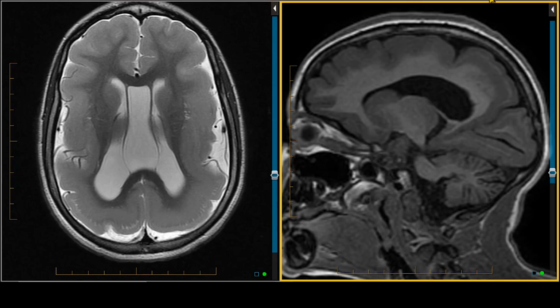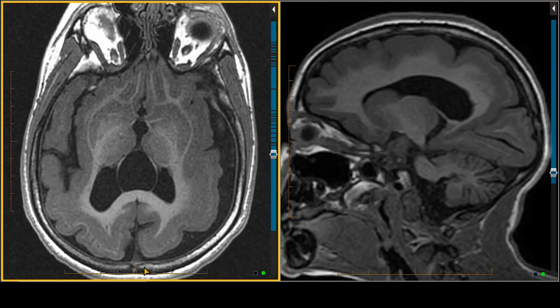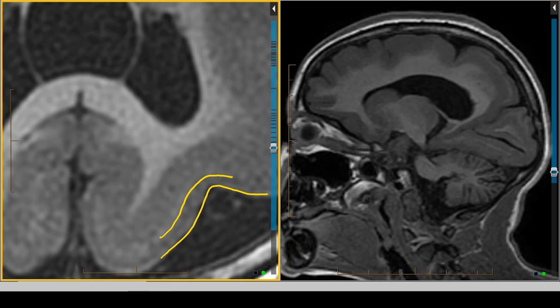What I'm going to do is show this on this T1-weighted image, and I'm going to zoom here. Here we can see there's a very featureless surface to the brain. Between the surface and this line is the gray matter. Subjacent to the gray matter is a cell-sparse zone, and beneath that is the band-type gray matter heterotopia.